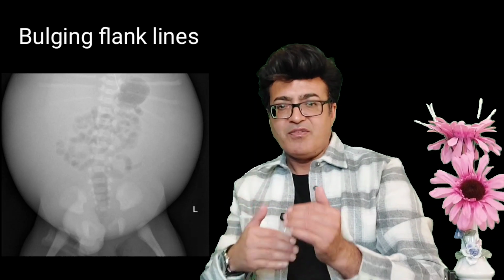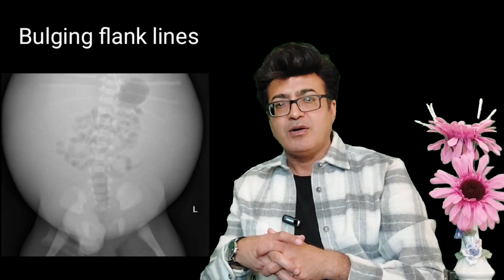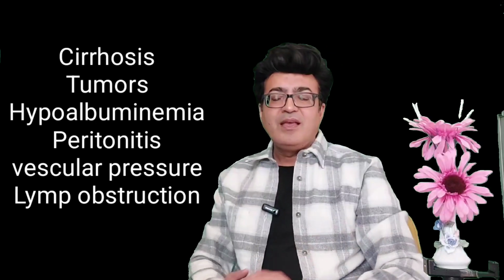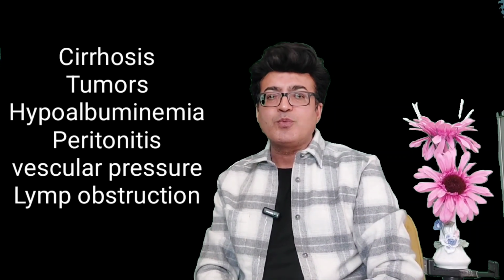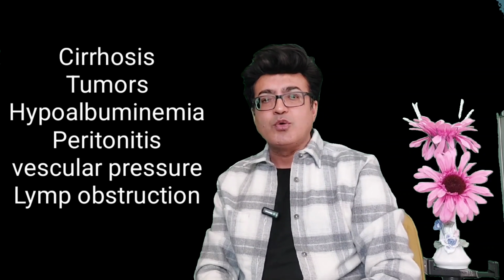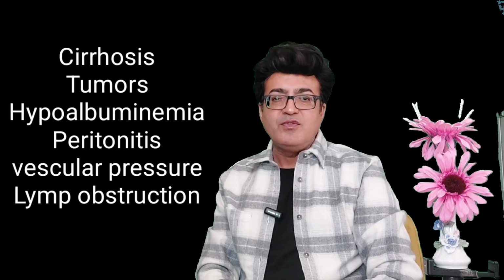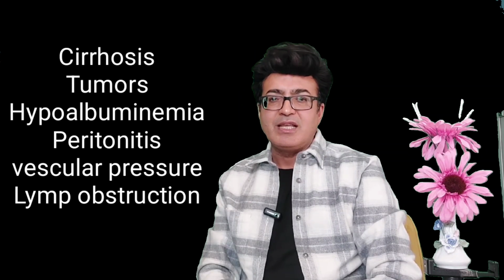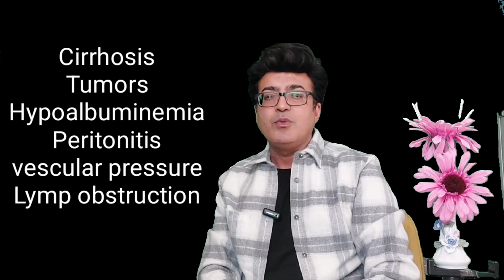There are multiple differentials. Let's start looking for the differential diagnosis of ascites on plain X-rays. There is a wide differential for ascites. The first and the important one is cirrhosis. You have to correlate with the clinical history and previous record. When you come across these three features of hazy abdomen, bulging flank and central abdominal gas on the X-ray, you must look for the detail and must look for the previous medical record. If there is any cirrhotic patient, there will be ascites.